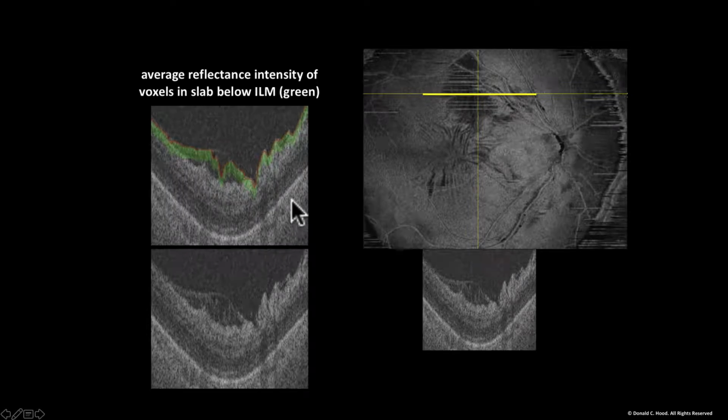Let's take this here and zoom in and take a look at a B scan here. That's what it looks like. So you can see why, if I tell you how this image is formed, you'll see why it does such a great job at picking up epiretinal membranes.